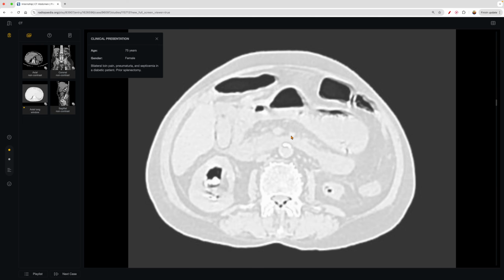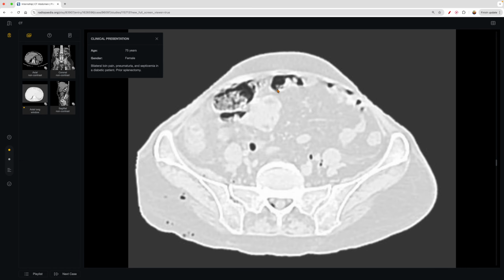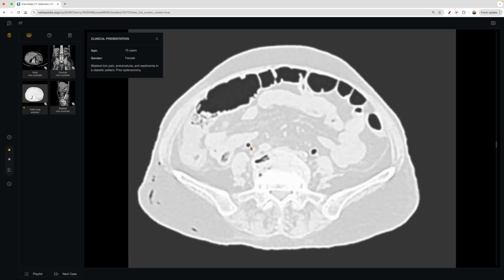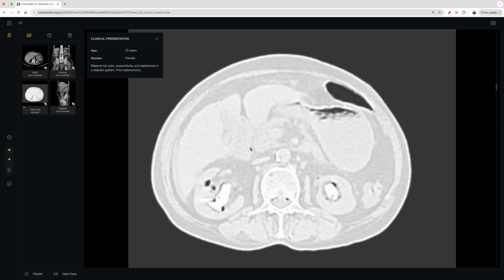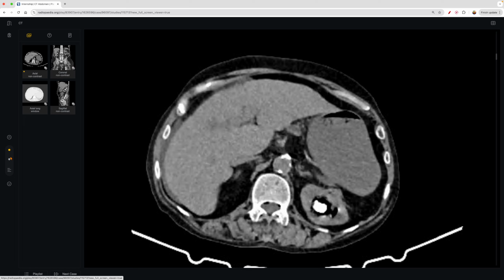And so they show here, this is a lung window. So we'll do a little hint into a case that's to be coming up. If you pull up a lung window and you're concerned for free air within the abdomen, the lung window certainly makes it easier to appreciate. In this case, the patient did not have that. Let's see what this ends up being. I don't know if there's anything here to show.